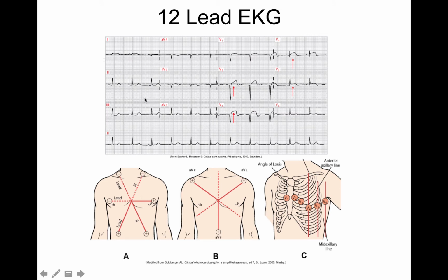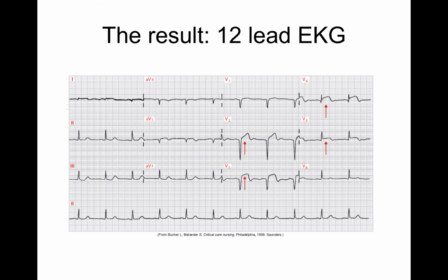What we are looking at here is 3 seconds of time, 3 seconds of time here, 3 seconds of time here, and 3 seconds of time here. So this whole picture is not taken all at one snapshot. It occurs over time at 3 seconds, 3 seconds, 3 seconds, and 3 seconds. The result is what we are looking for. We'll get more into detail, but we're looking for classical findings of ST elevation and ST depression.